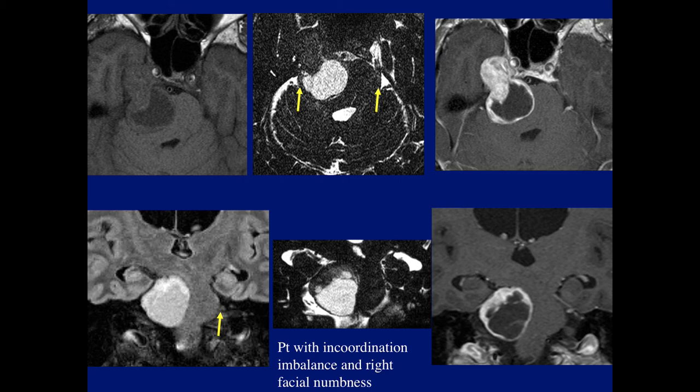Asif and Eric both mentioned that correct diagnosis. This was a cystic schwannoma. Again, trigeminal schwannoma. Again, this patient was operated, and here's the lesion. You can see the trigeminal nerve actually kind of displaced.